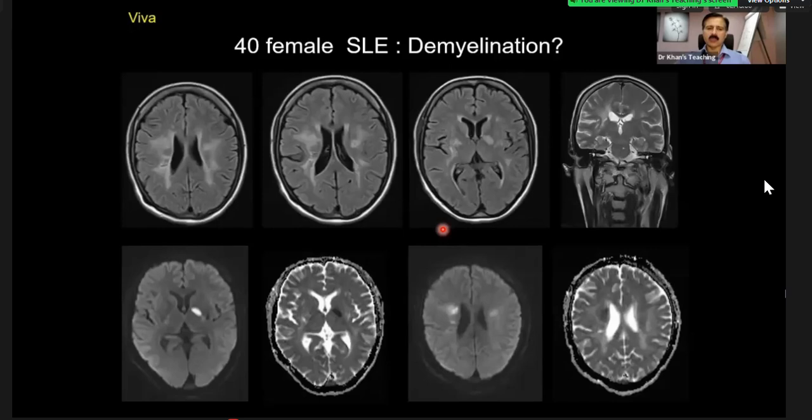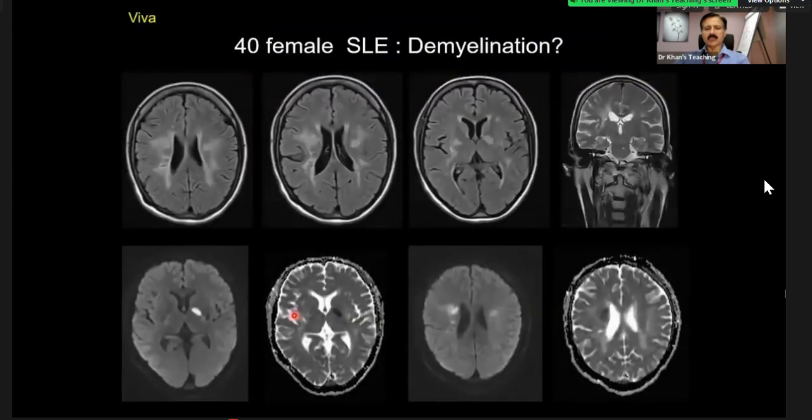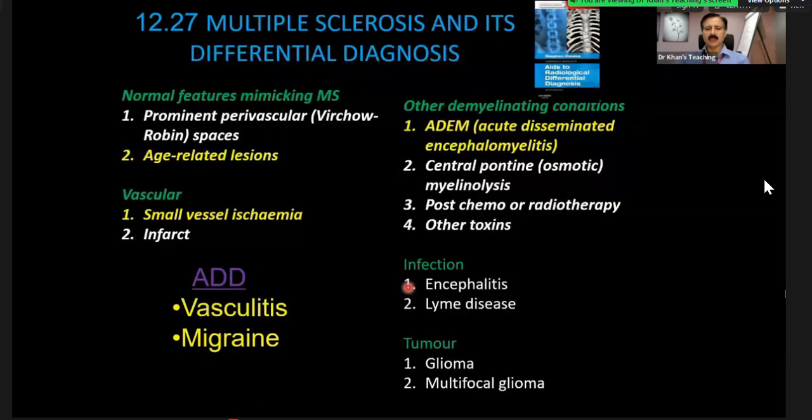Of course, there can be types of vasculitis in which large territory infarctions can also be seen. But if you see here, there is a lot happening, confluent high signal, there is a bit of gliosis, basal ganglia involvement, and then there is, at this internal capsule, an acute lacunar infarct. In the centrum semiovale here, again, acute infarct. So this is vasculitis. And as I told you previously, vasculitis should always be considered in the differential diagnosis. But in the exam, clinical presentation is important. But if the examiner tells you that this is the first presentation, you can go with the same debating point as we have already learned.